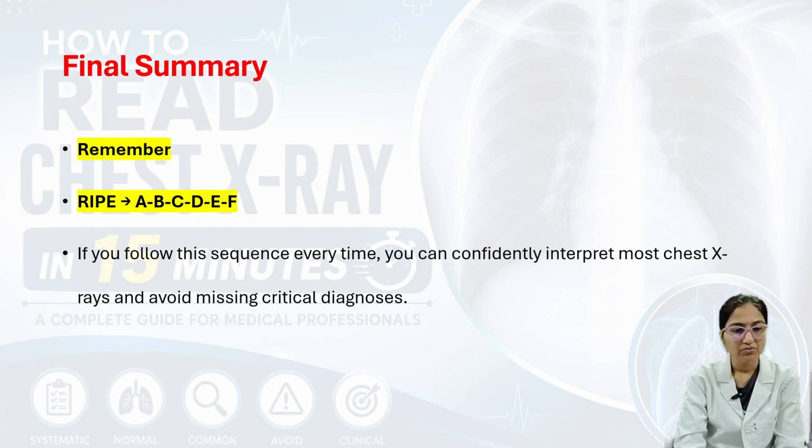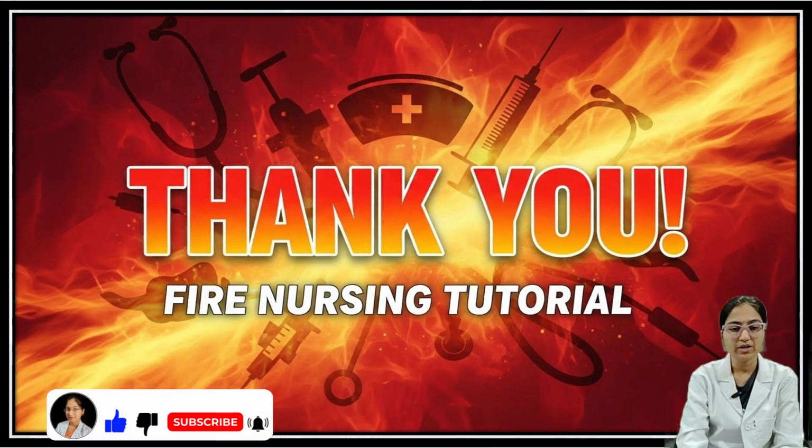And next, the final summary is that you need to remember the ABCDEF method. If you follow this sequence every time, you can confidently interpret most chest X-rays and avoid missing a critical diagnosis. I hope you all are very clear with this topic.